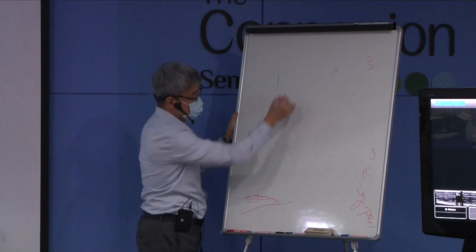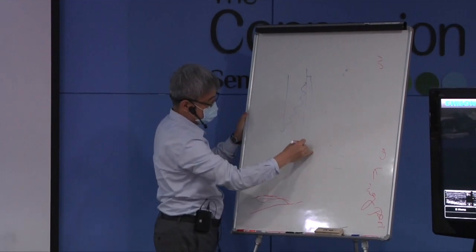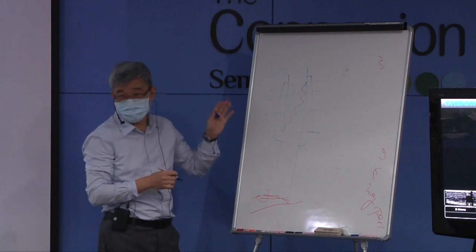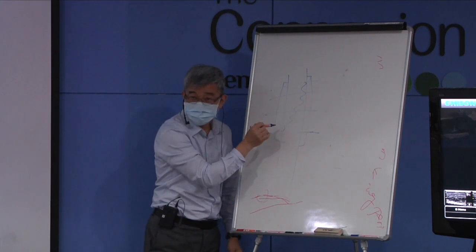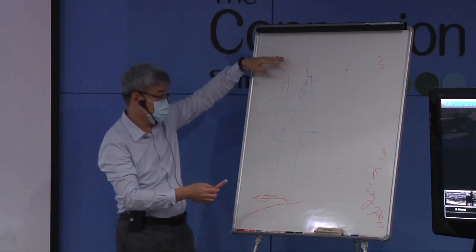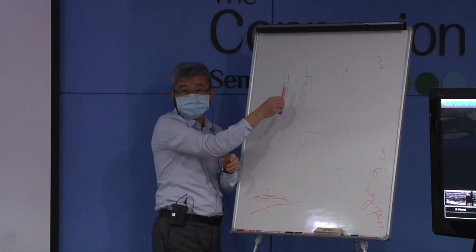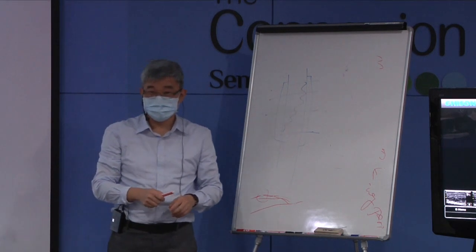Basically, the plate and screw only cover a certain range of the fracture site. You can find the space to look at. Easy, very easy. For example, in this case, the plate and the screw, you can look at it from this side. You can find the space, no problem at all.